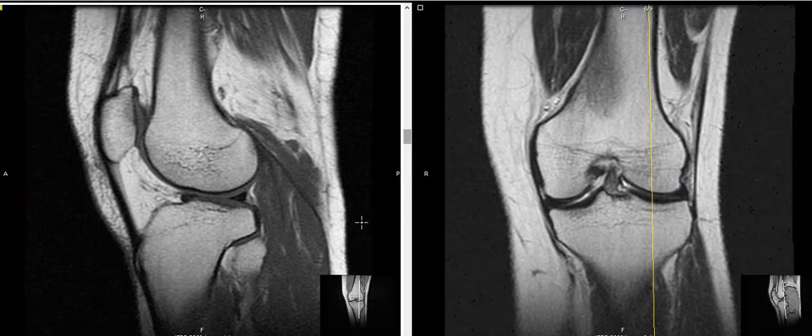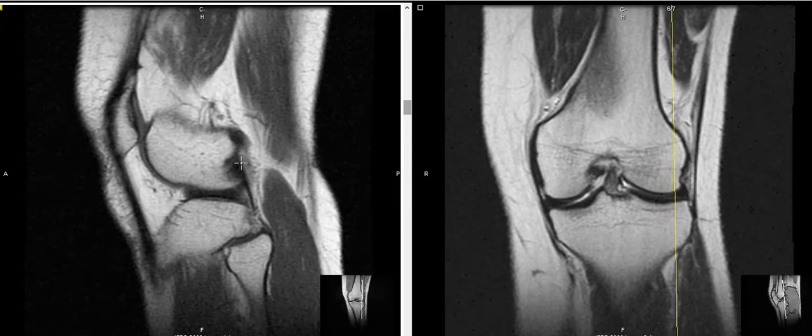He injured it in the back, and over time it has not gotten any better. He now feels some soft tissue fullness back there and some knee pain, and so he came in for an MRI, and his knee joint looks very good.